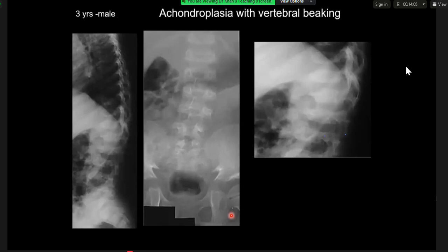On the lateral projections, I can't really see full details within the whole spine image, so I just comment on the zoomed image. There is abnormal bullet-shaped vertebrae with decreased height and shortened pedicles as well. I can't see any other abnormalities. Excellent, well done. Good. Thank you.